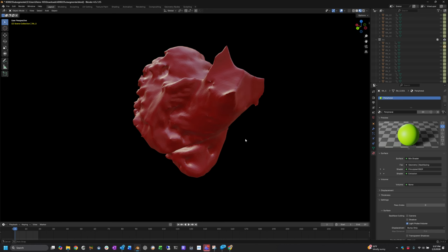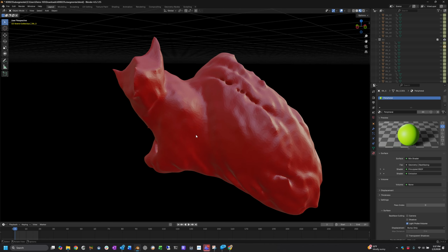So for mesh matching, first step, I would pick a starting point in end systole that you like, where the aortic and mitral are a good averaged, nice look, and an end diastole with a good aortic and mitral valve, and see how those look.